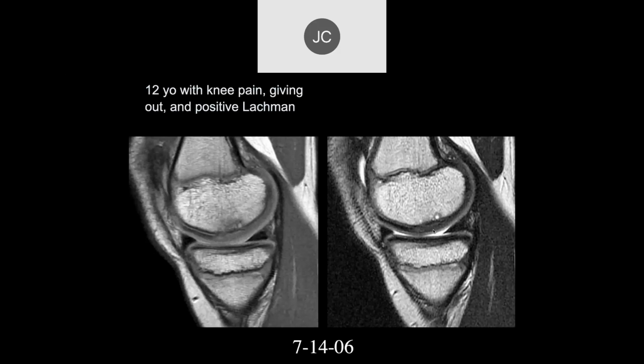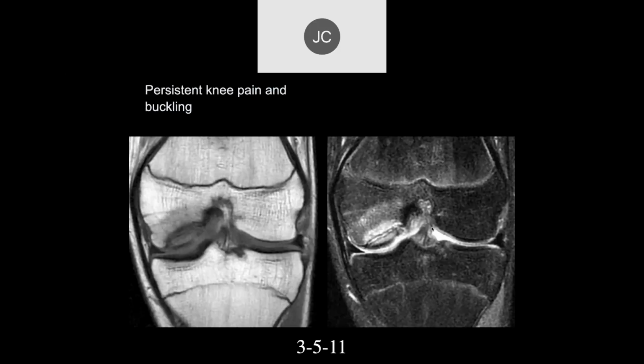The cartilage is deformable without breaking. The subchondral bone and the trabecular bone here are more rigid, and if it impacts enough, instead of just giving way, you go past the deformity stage into the fracture stage. So we have subchondral trabecular fractures. You can see the subchondral bone is probably depressed a little bit here as well, though the overlying articular cartilage is intact. If you remember, in this case the kid came back 5 years later, and this is what it looked like 5 years later.